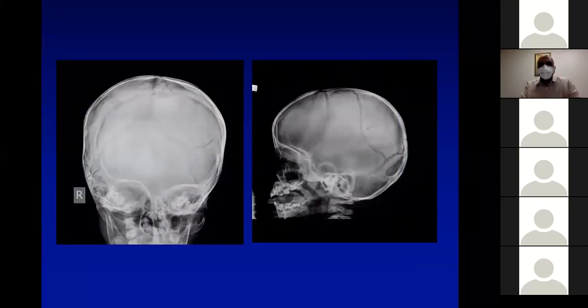This is a small pathology where you could identify a fracture in the skull of a child. You could see that this is a fracture line, which is indicated by an arrow. And you can again identify this fracture on the AP view.